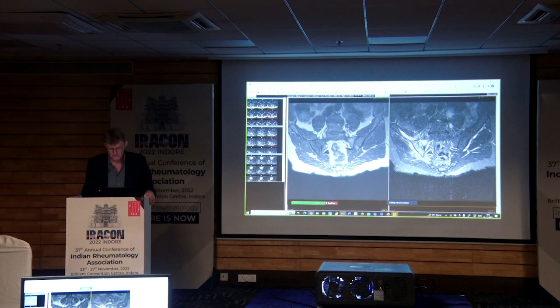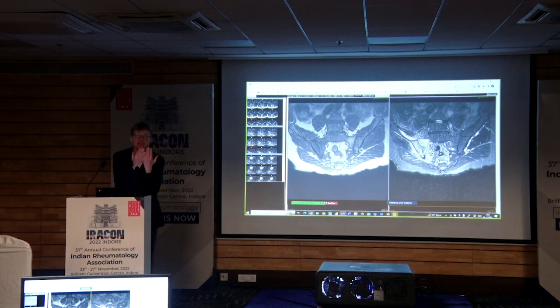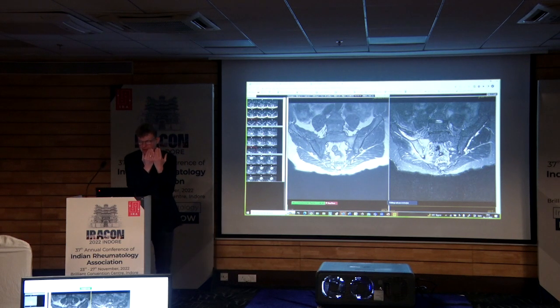And then there are these issues about whether there's ankylosis, which I can fully understand why you say, because you can't really see the joint space in the T1. But the reason for that is that you have so much water here due to the infection, lots of water in the bone, lots of water in the joint space, and lots of water in the bone on the other side. And then it gets the same color on the T1 image. It's not because it's ankylosed.